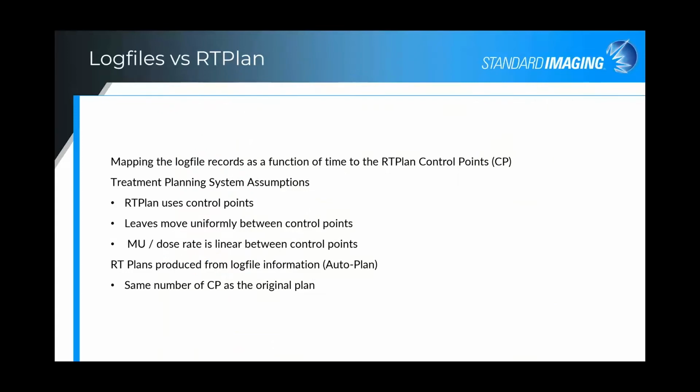So once one understands the information coming from the log files, the next step is to be able to map the log file records to the RT plan control points. And this is where Linac View comes in.